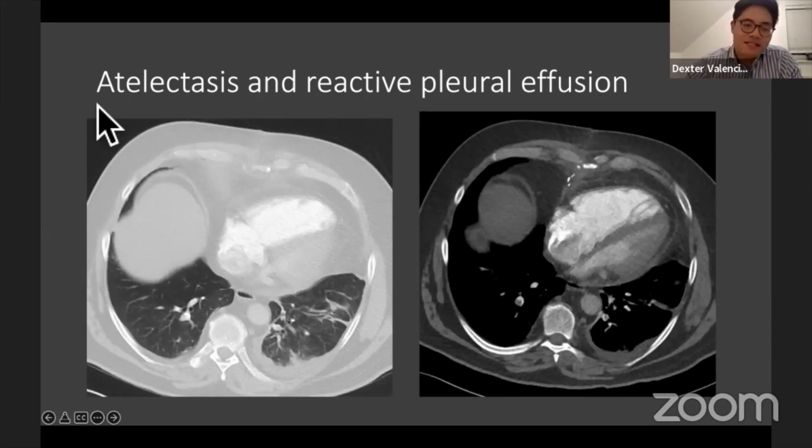And there's something called atelectasis. So anyone who's ever done a surgical job, after your patient has surgery, they might be in a bit of pain. They're not taking big breaths in. What happens is far into the lung parenchyma, quite distally near the edges, there's bits of alveoli that aren't quite expanding, and they sort of fold in on each other and they haven't quite expanded. So it's just distal collapse.